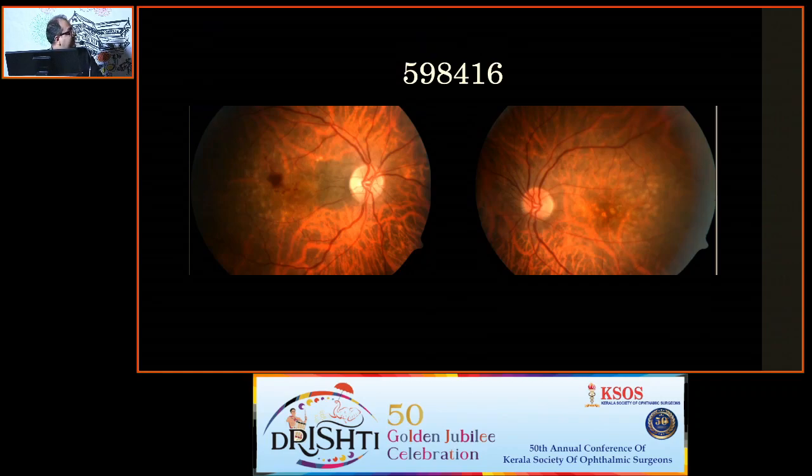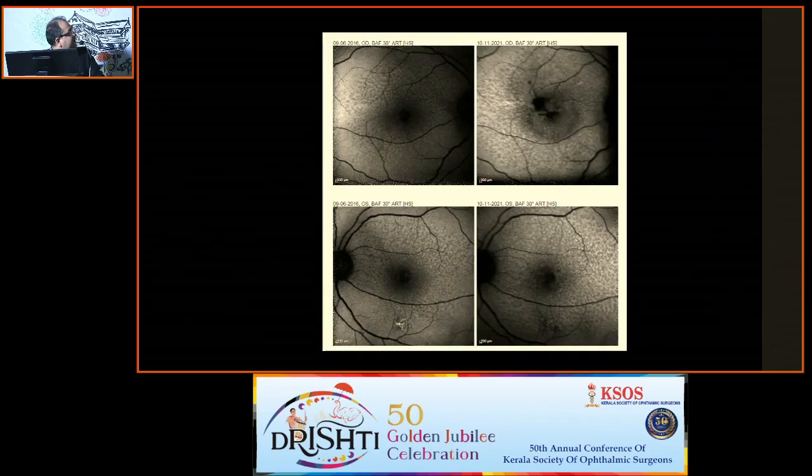Now, this is one case in which we saw the fundus of a patient who has drusen in both eyes, and the right eye also shows a focal hemorrhagic lesion. This patient had been followed up over a period of 5 years. If you look at the autofluorescence in the right and the left eyes, 5 years apart, there's not much of a change other than the increase in hypoautofluorescence in the right eye, and the multiple punctate lesions which are seen scattered all around are typically known as reticular pseudodrusen.